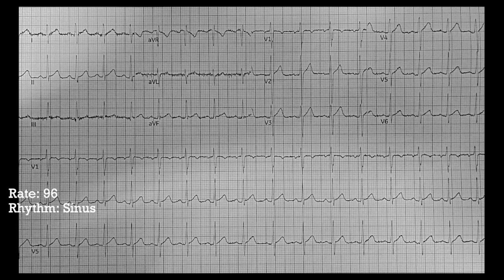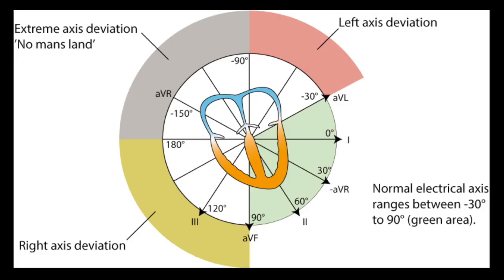Let's talk about the axis for just a second. And again, if you had to skip something, I usually make it axis because it doesn't really influence the way that I think about EKGs. But just for the sake of doing it, let's talk about axis real fast. You may have run over this before. It's sometimes a little bit difficult to conceptualize. Let's hit it real quick.